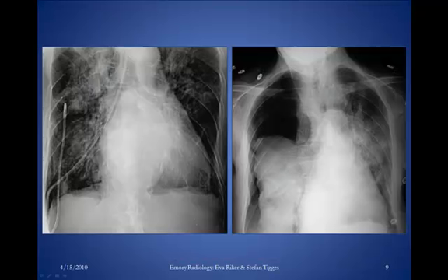No harm done. Another example, on the left, you can see that they've put this feeding tube in place, and it's gone down the trachea, down the right main bronchus, and down the right lower lobe bronchus, and it's been pushed in so far that it's gone all the way into the pleural space. So when they pulled it out, they ended up with a pneumothorax. And the image there on the right is after they pulled the feeding tube out, and you can see that the patient has a resulting pneumothorax, and that white blob in the right hemithorax is the collapsed right lung.